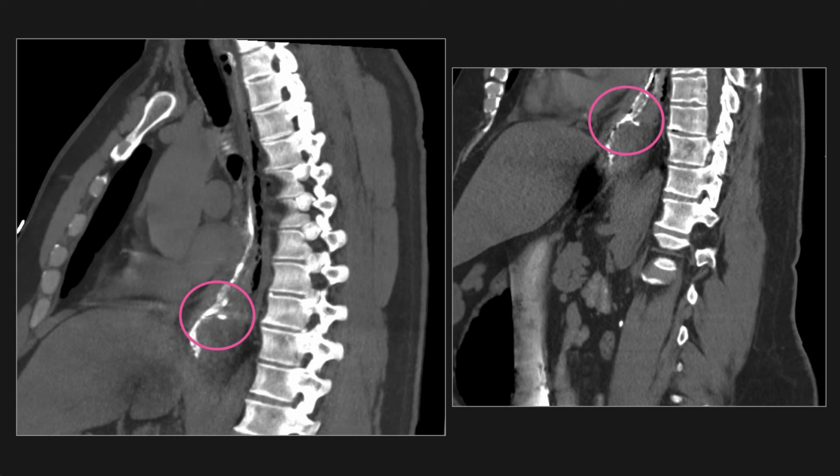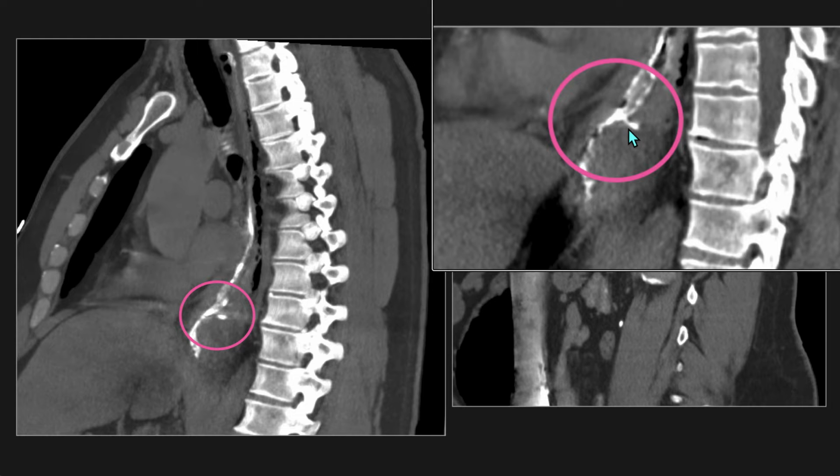So I improvised a bit and called our CT techs and had the patient brought over for a limited CT of the chest after having him drink a bit more on the table before the scan. And after seeing the leak on CT, it's hardly a surprise to me that I couldn't see it in fluoroscopy, as it projects posteriorly, overlapping with the spine, and had a relatively thin and subtle channel.